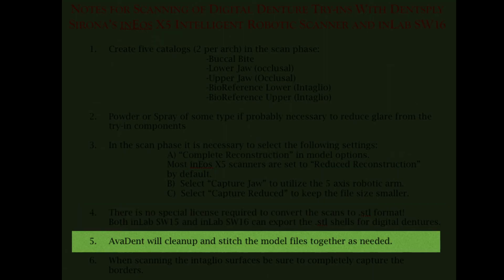5, AvaDent will clean up and stitch the models together for you. You don't need to do it. You can clean them up if you want to, but if you're not comfortable with it, by all means let AvaDent do it.